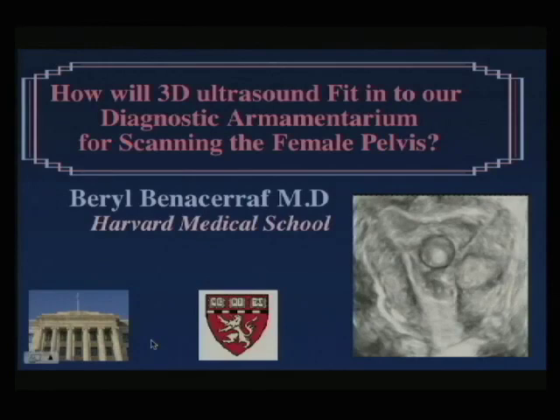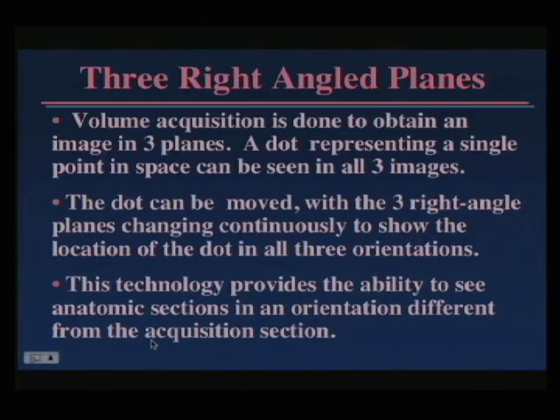This lecture is about 3D ultrasound and how you can use it to evaluate the female pelvis and how it can really add to the diagnostic capability of ultrasound in evaluating gynecologic patients. What is 3D ultrasound? It's really a volume acquisition of an entire area of volume that you can then slice and dice in various orientations to tease out information that is held within that volume.